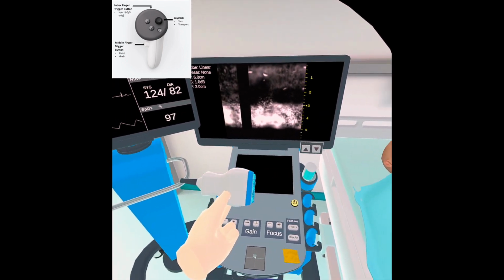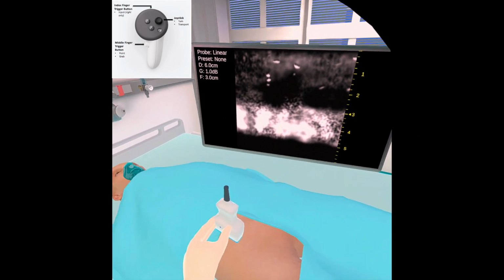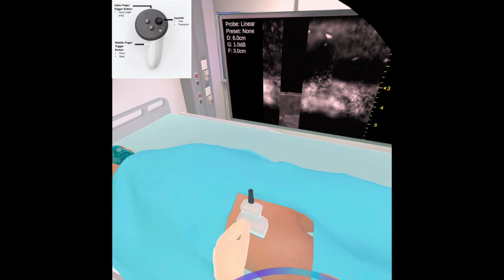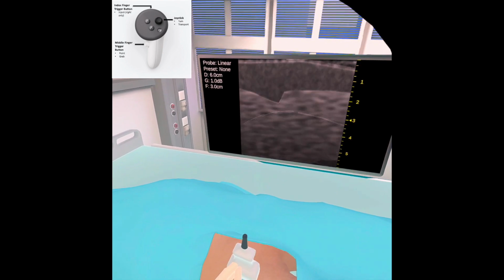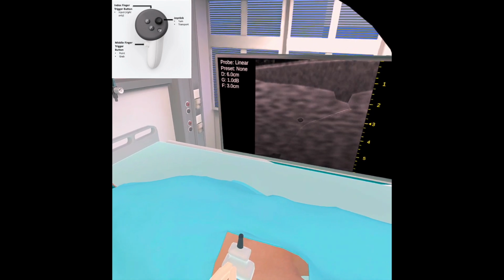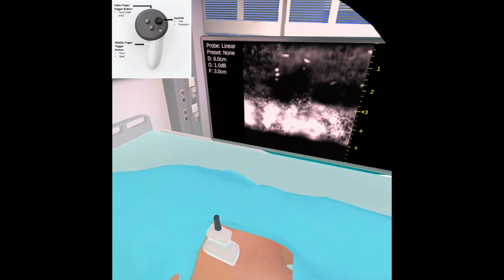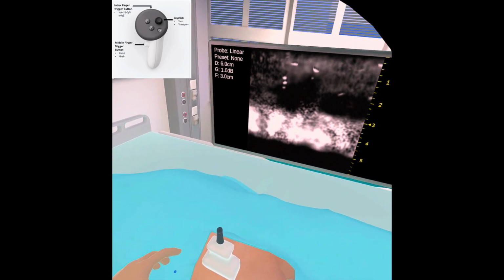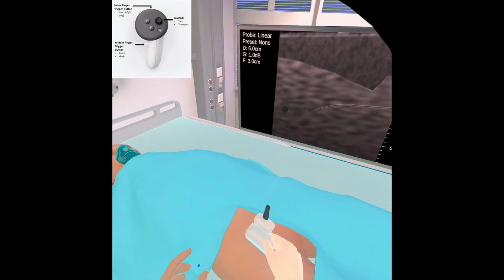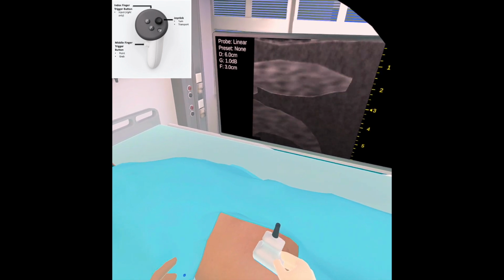To actually scan, simply, again, same as you normally would, you hold on to the ultrasound probe here. I'm going to adjust my screen. And as you can see here, you can scan the desired sono anatomy if you like. For this particular module, because we're focused only on the suprainguinal fascial block, we only have the anatomy for that particular block. As you can see, once you go outside of that area, the anatomy becomes less distinct and obscure.